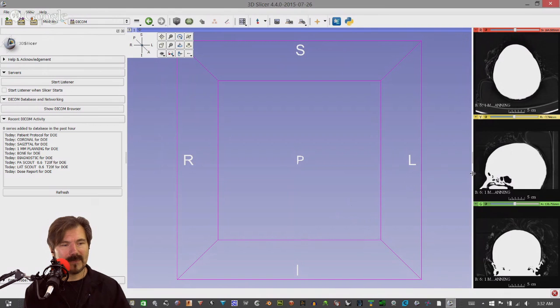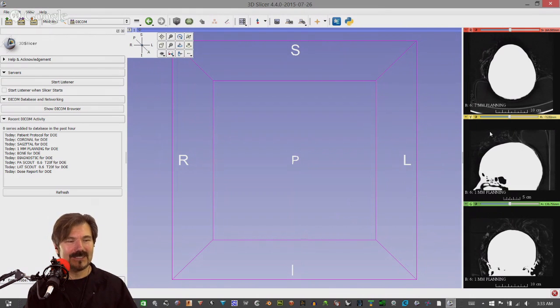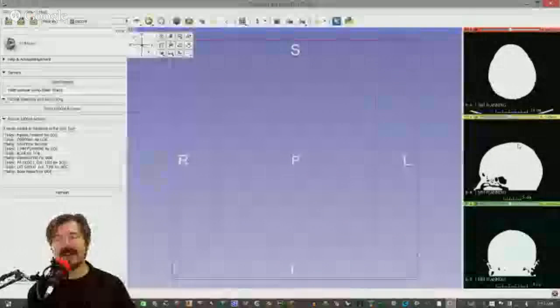So notice, with the 1 millimeter, and again, I don't know how much energy they used, it's like a light bulb. It just kind of highlights, and that's the external tissue. So we're not even just looking at bone. I thought that was a little peculiar. And notice if I make adjustments here, I still can't. I just have a white blob.